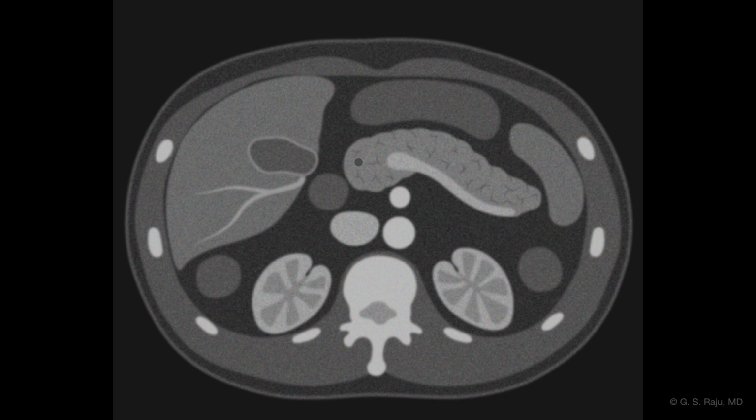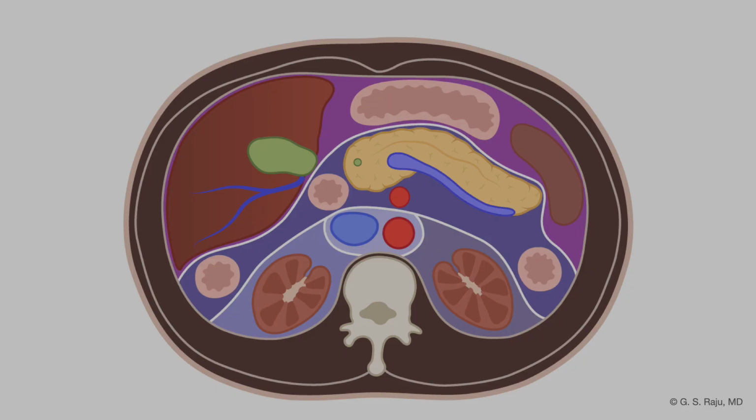So for this, what I've done is to appreciate the grayscale image here on CT with IV contrast. Contrast fills up the vessels. I've also used color images, and then upon the color image, I superimposed the grayscale image of CT for your easy understanding. So let us start this.